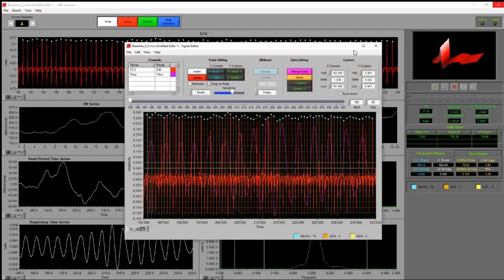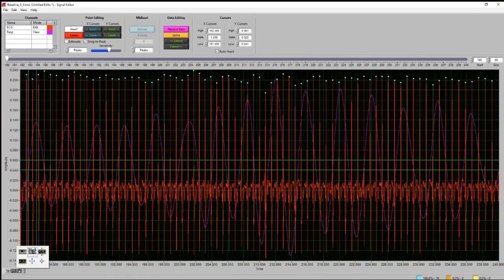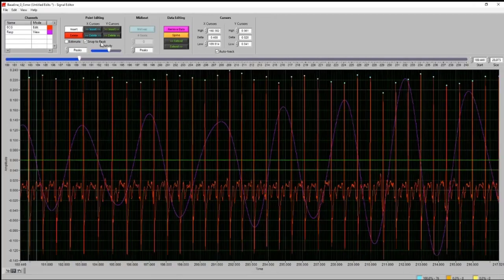What we'll see here, and again, this would be better if I had a specific example to show you. But really what we want to do is when we see that yellow dot, I'm going to go ahead and just put one in here for us. Okay, so let's just pretend that that was initially there. What likely could have been occurring is that it's the arrhythmia, or that change in the IBI was driven from the respiration. So in most cases, hopefully always, when we breathe in, our heart rate speeds up, and then when we breathe out, it slows down. So if we do that in a dramatic enough fashion, we can actually cause a very short or very long IBI depending on where in the cycle they are.